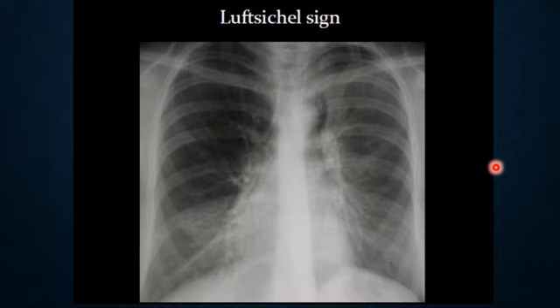شايفين المنجل؟ منجل مال الفلاح؟ Luftsichel. It means Luftsichel بالجرمن. Okay? اللي هو sickle. سامي sickle cell anemia وكذا. The sickle is the Luftsichel. Okay? So this is number one. So we know what it is, Luftsichel. What do we mean? Now, what does it indicate?